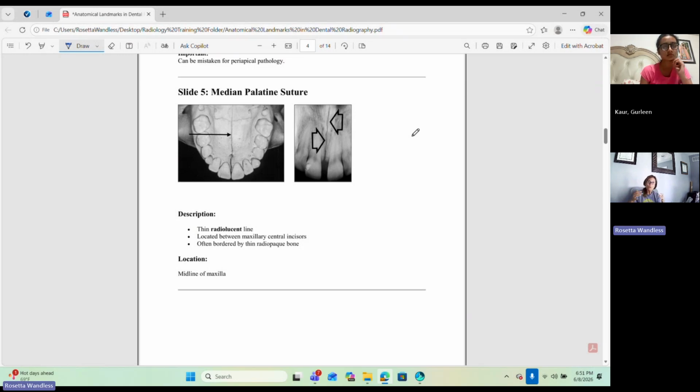When you're looking at this, you can see this is a suture here, and there's a cross suture as well. Do you see those sutures there? It shows up like this crazy line here. It's very definitive. Why do you think it's definitive there? Look at it. Do you think this is a child? No? You don't think so?